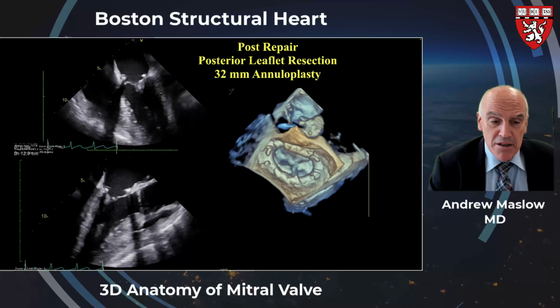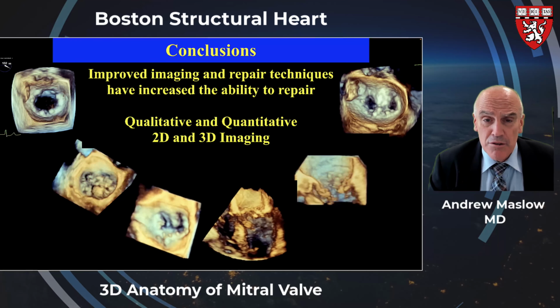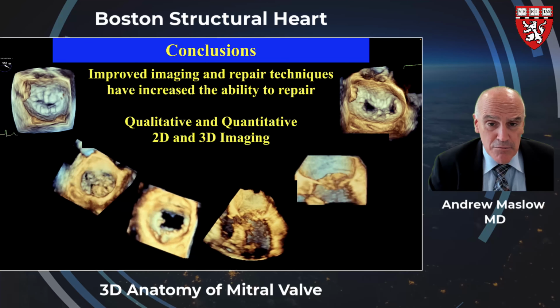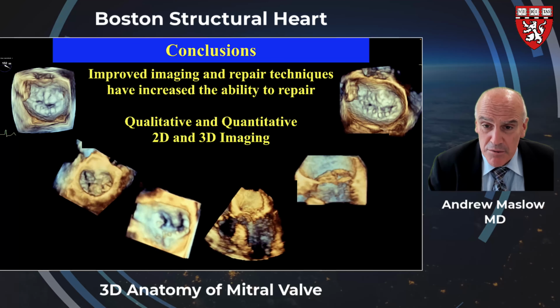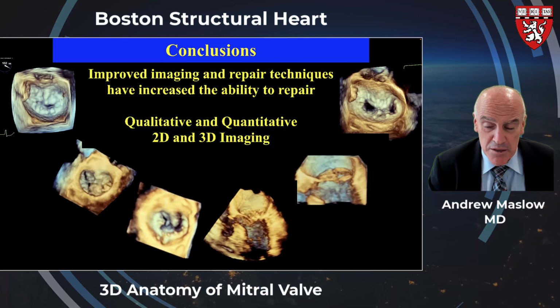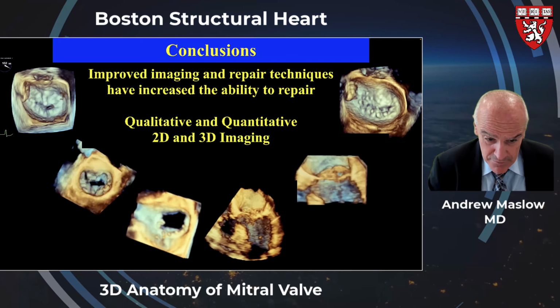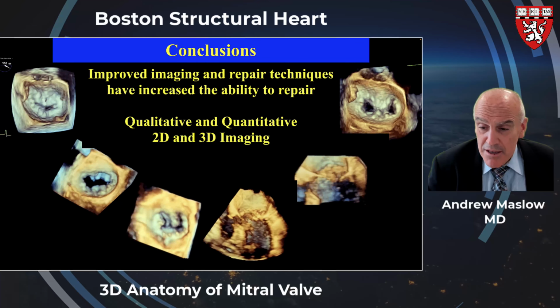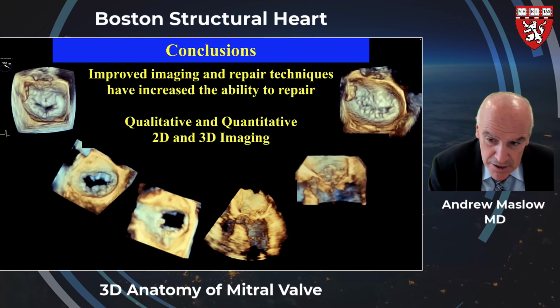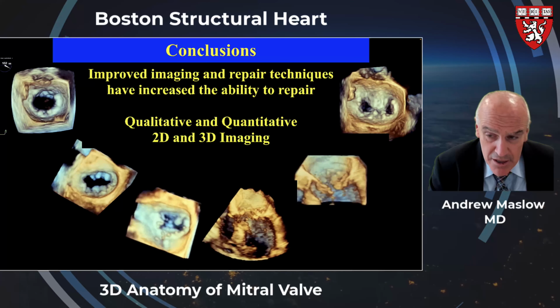This is the post-repair of the same patient, a successful repair. So in conclusion, with improved imaging and repair techniques, we have improved our ability to repair more and more valves and offer options to patients who might not otherwise be good candidates. In the bottom four views, you can see a pre and post three-dimensional en face view, and then a coronal plane of a bileaflet myxomatous valve, and then its post-repair imaging.